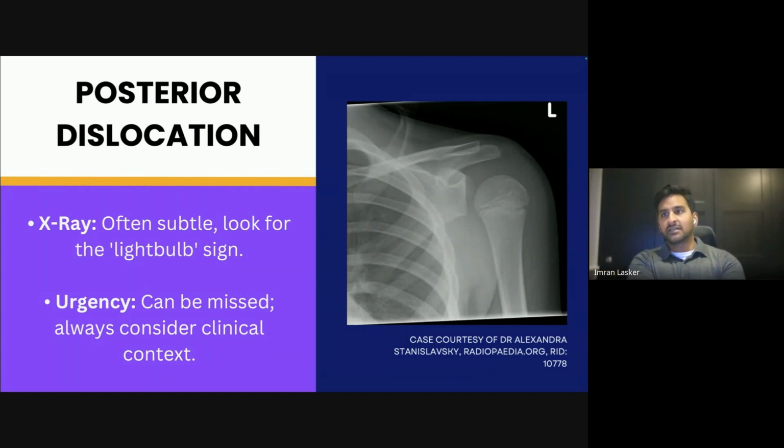So this is our young person. By the way, they're young because they've got growth plates. Growth plates look like this. And like I said, don't get worried. Don't think, oh my God, they've got a massive fracture. Have a look at the edge. Go all the way to the edge. You can see it looks very sclerotic as you get to the edge. If it wasn't, and looked very linear and abrupt, then you think, okay, I think this person's got a fracture. But when it looks like this, you've got to think to yourself, okay, that's probably a growth plate and this is a younger person.